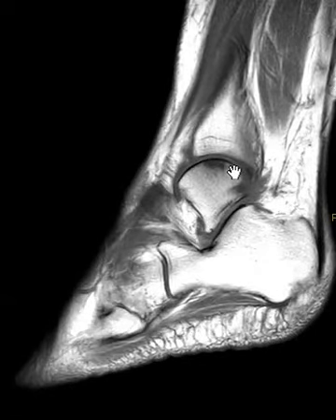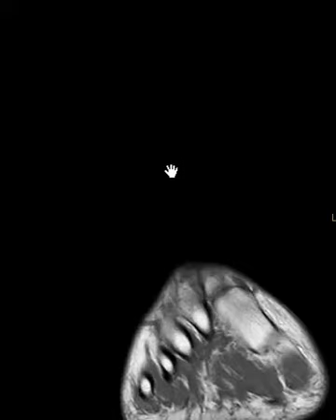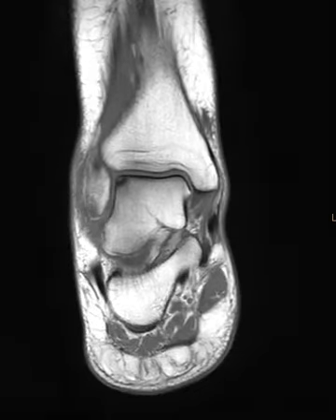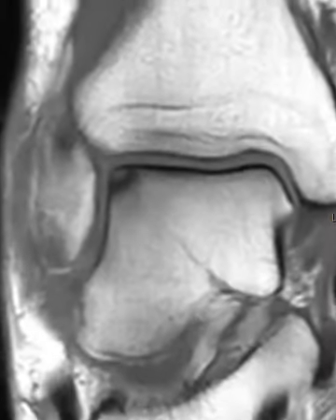This is part of the lateral talar dome. There's a small defect here. We call this an osteochondral defect because it involves the articular surface cartilage and the subchondral bone. So right here, this little dark area is the osteochondral defect. You can zoom that in up here.